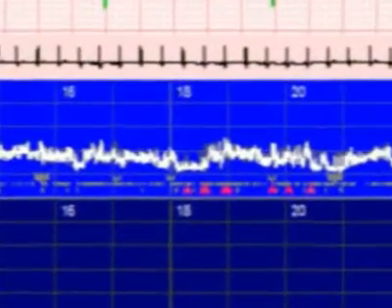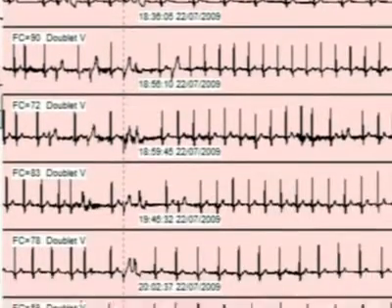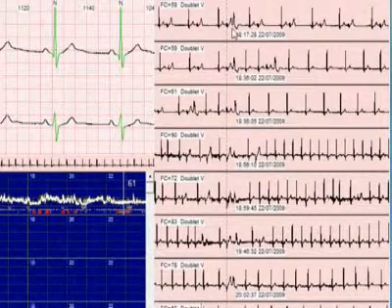The icons always appear in gray, except for the couplets. The samples only show ventricular couplets. We can then quickly choose a few couplets to print.